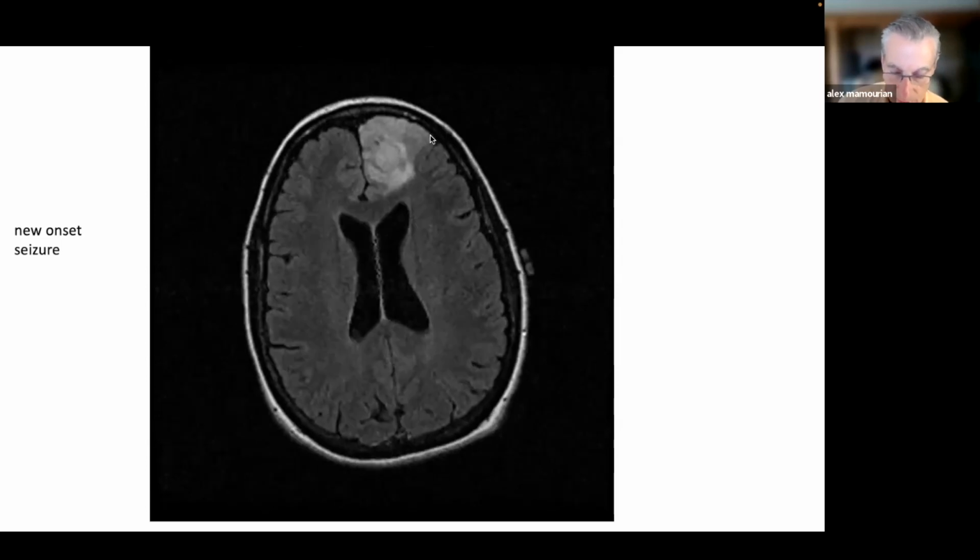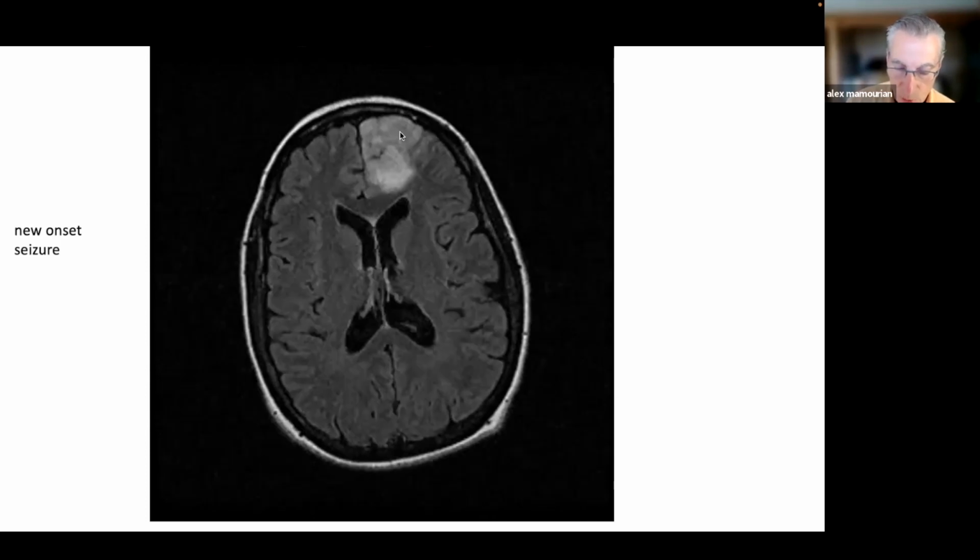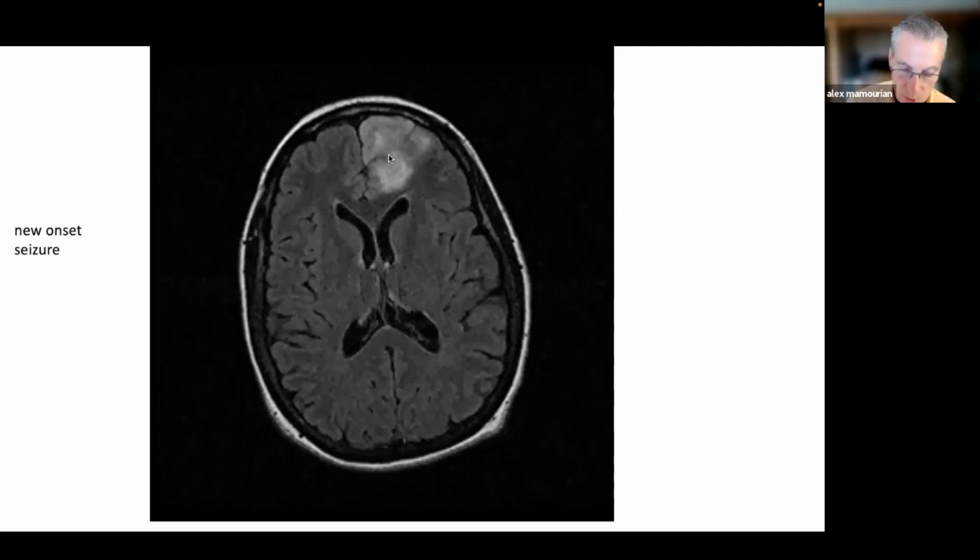Do you see the way that this extends more laterally, kind of fans out in this location? There's also swelling here, and presuming that this patient presented acutely, you should not have mass effect on the first scan. And the extent of this laterally, even though there is some variation in vascular territories, this appearance should suggest that this patient has a tumor as the source of their seizure.